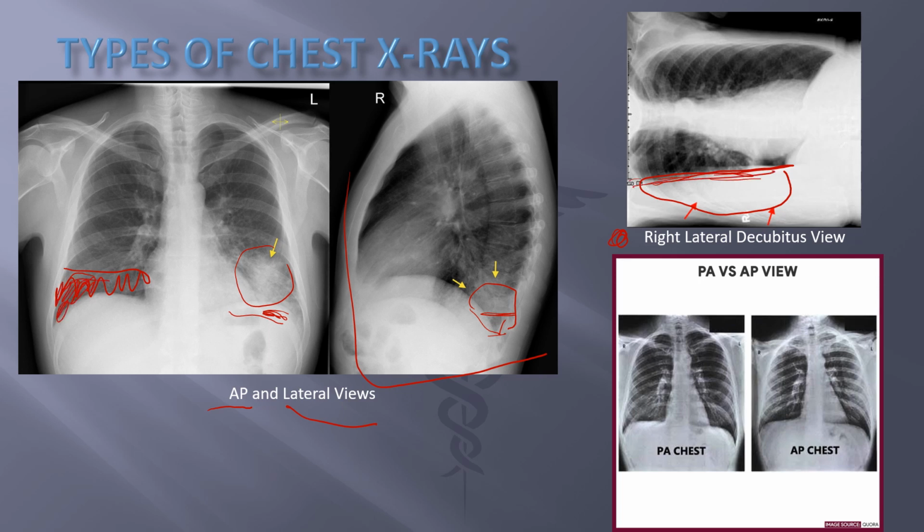If it layers out, then you know it's a thinner fluid, a thinner pleural effusion, and it might be amenable for thoracentesis or drain from there. If it remains in this position, it's more of a consolidation, or it can be an empyema, where it's more of a pus situation, where it's thicker, it wouldn't layer out.